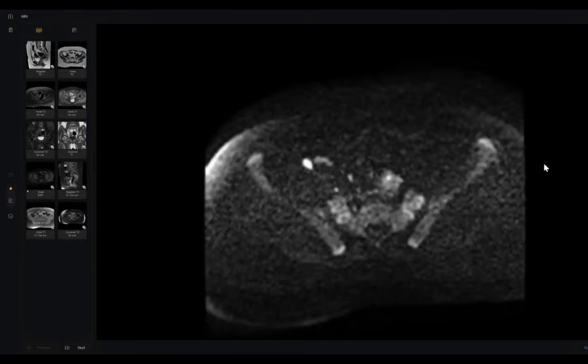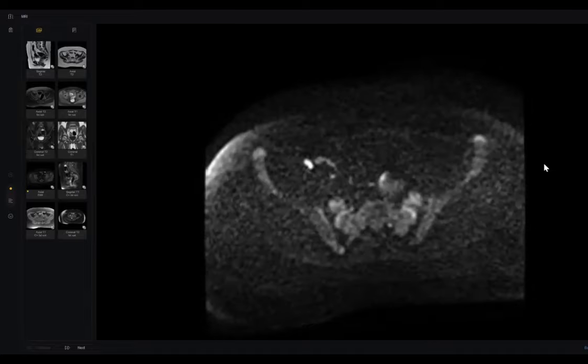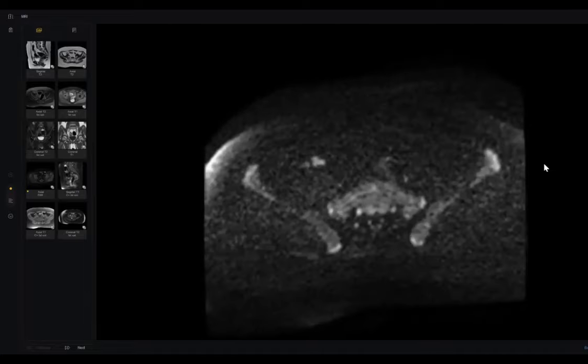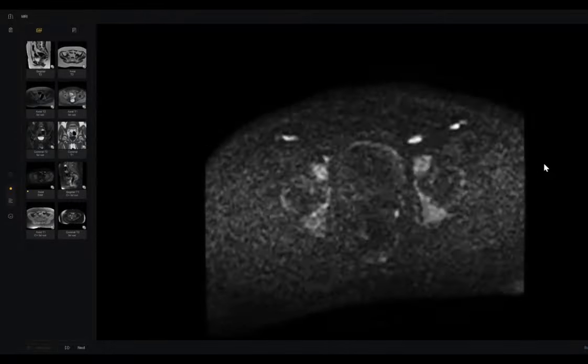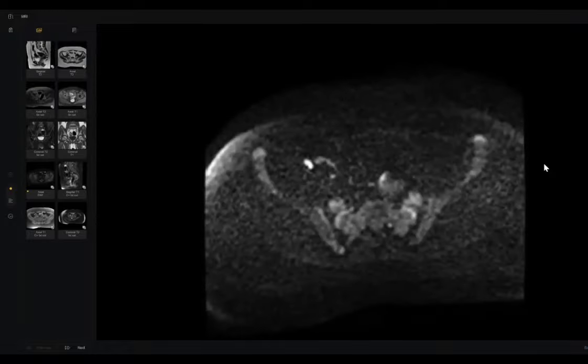I think it's a case of ambiguous genitalia. Do you know any syndrome? Because many syndromes may present like this. Maybe Klinefelter syndrome. What else? I don't know. I told you this testis is restricted in diffusion, and diffusion is the best sequence to detect intra-abdominal testis.